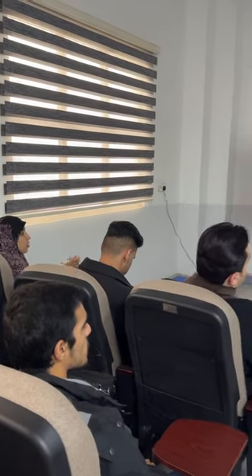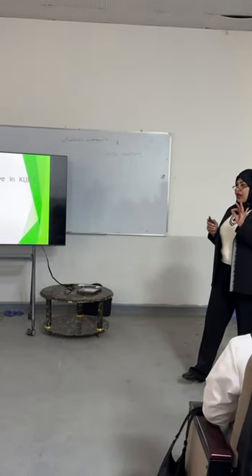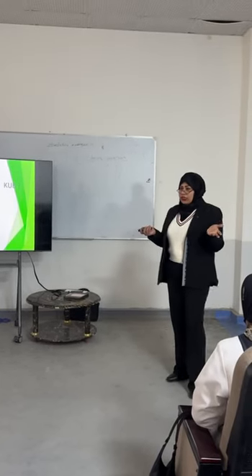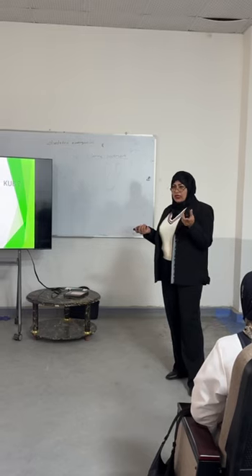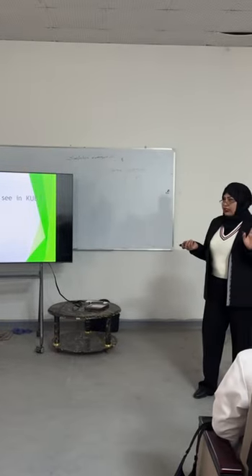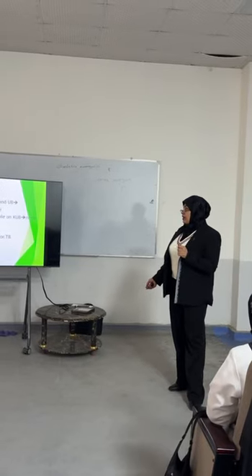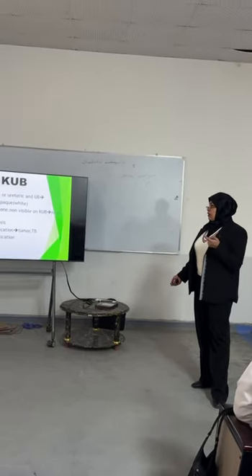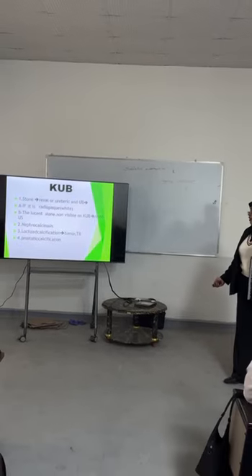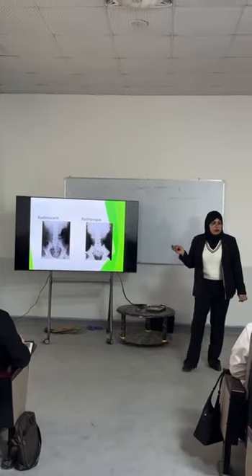As a calcification. So, generally, the KUB can see just the radio-opaque lesion, any white structure. Any other things cannot be seen. So we can see stones, whether renal, ureteric, or urinary bladder stones, nephrocalcinosis, localized calcification due to TB and tumor, and prostatic calcification.